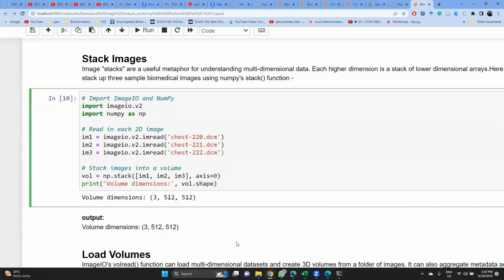This data set contains almost 2,500 images, but I have put in a few images to demonstrate this demo. We have to use this type of code if we have to analyze four or five images from that particular data set. How can we do this?